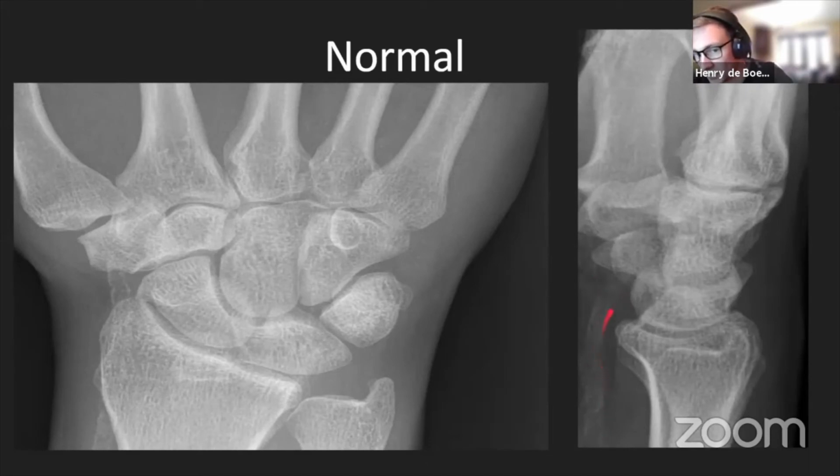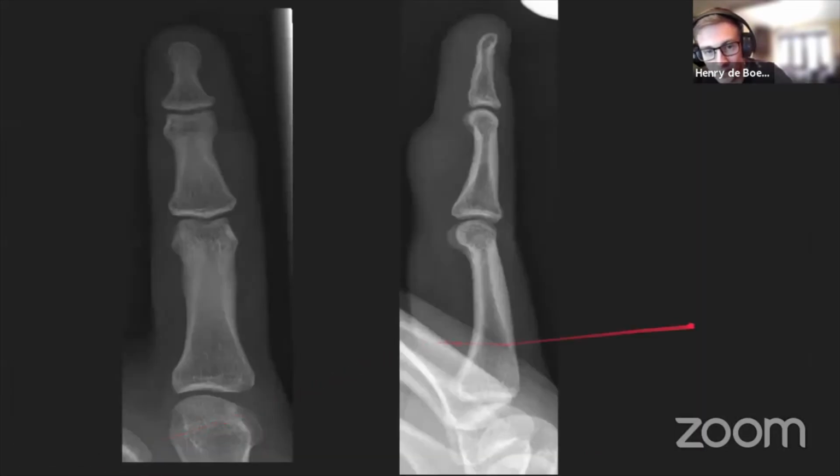If they were 90, you'd probably ignore it. But if this patient wasn't known to have any history of any medical conditions and they were in their 40s or 50s, I would probably comment on it as an incidental finding, because that's quite a lot of calcification, and it could be the first sort of sign that maybe they are at high risk of cardiovascular disease. Okay, so the next case.